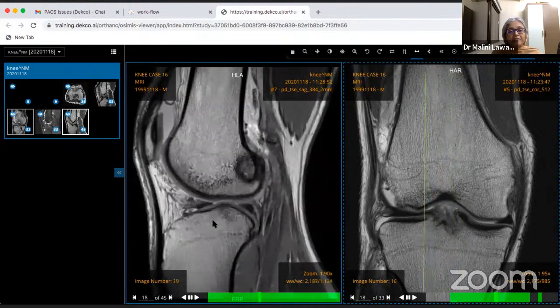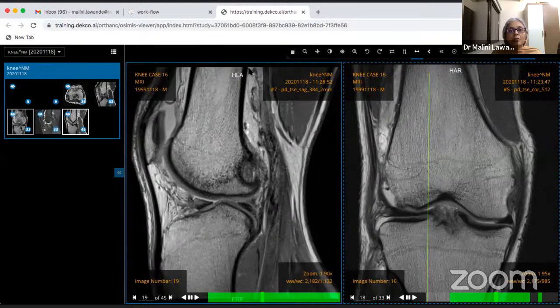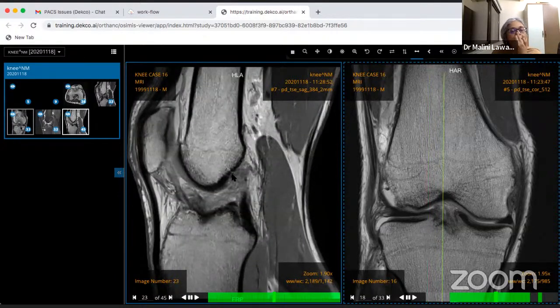If I look at the femoral tunnel, how do I make out whether it is fine or not? This is where the femoral tunnel is just about coming out. I draw a line along the posterior femoral cortex. So the femoral tunnel should lie posterior to it. If the femoral tunnel lies anterior to it, that is not normal. And based on that, you may have a more vertically oriented ACL or a more horizontally oriented ACL.